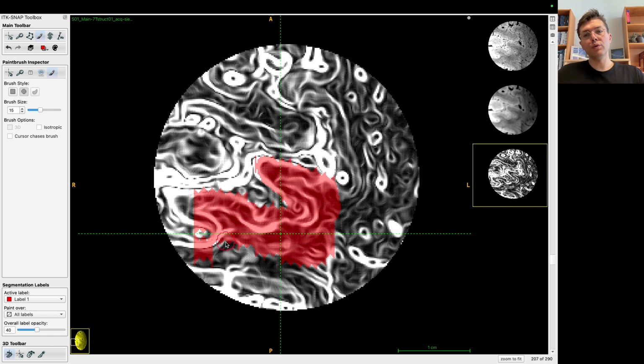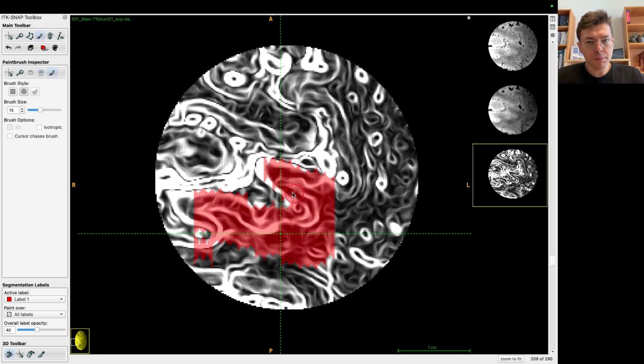And now you notice that I am only filling in, which means that I'm not reducing stuff, because the way you add material or subtract voxels interacts with how you plan to do closing or opening operations, the one I showed. So closing works when you fill in stuff, and it fills the in-between stuff that you already filled in by skipping. Anyway, hopefully you will see how I am doing it by watching me do it.